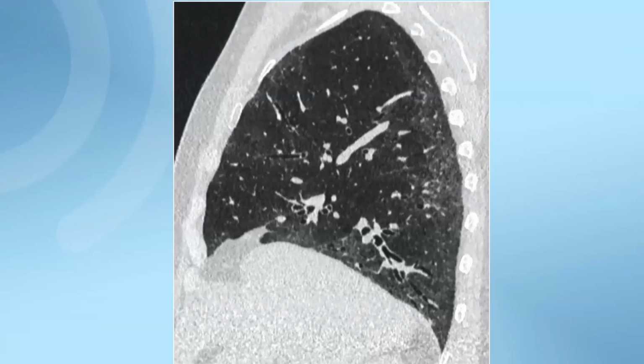Okay, so let's start off and let's see what you learned so far. The question to you is now, which kind of pattern do you see here in this patient? And I think that's question set 2. So if we could start the polling now with question 2.